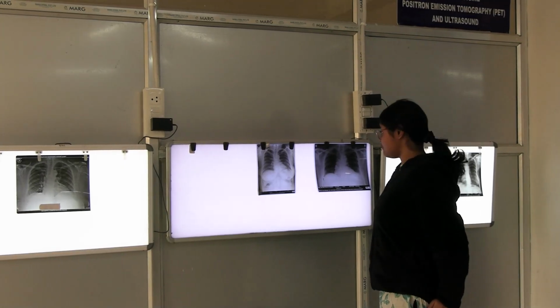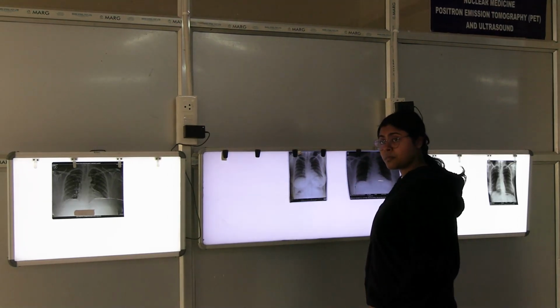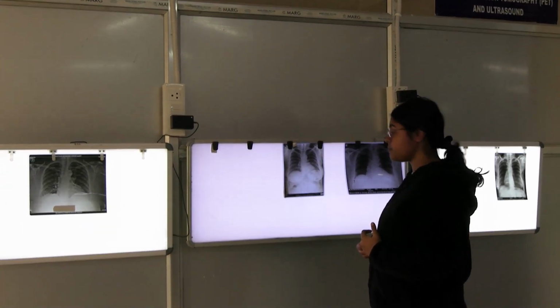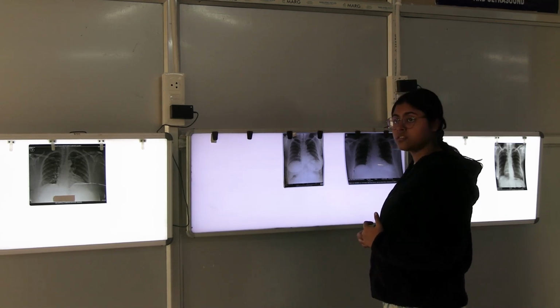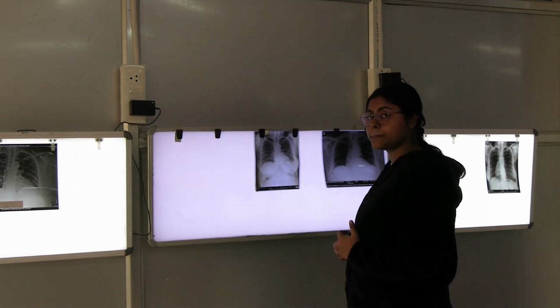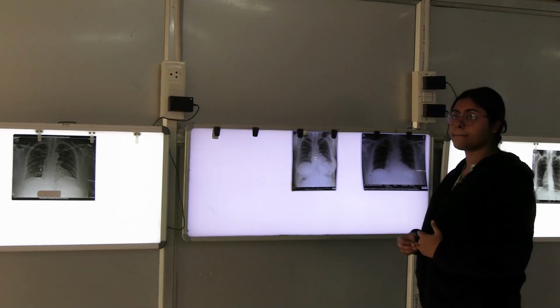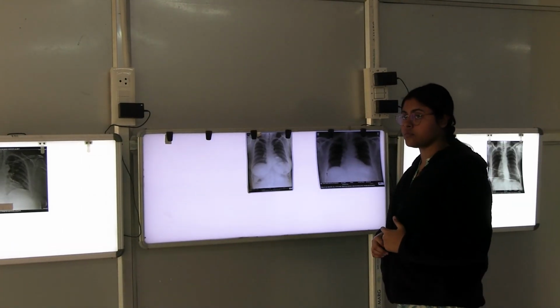Which ribs did you see? Okay, ribs are there. What margins are you seeing here? Is the margin here the anterior end of the rib or the posterior end of the rib? Posterior end of the ribs. So this is a PA view. For the ribs which you are seeing here, the shaft of it, and whether you are seeing the anterior end or posterior end is commonly asked. This is the posterior end of the ribs which is visible. Rib is counted from back to front.